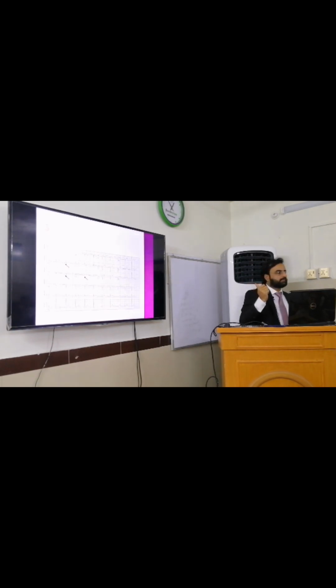Why do we call it the low atrial rhythm? Because it is not the SA node that is depolarizing the heart. It is the atrial myocytes that are depolarizing the heart, and that's why the P wave produced is quite different in morphology, right? You understand my point? The P wave is inverted here. That's why we call it the atrial rhythm, but the QRS complex is narrow because the ventricles are depolarized from that P wave that is coming from the atria.